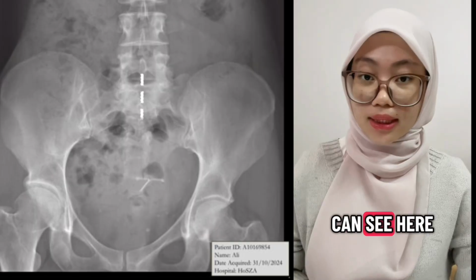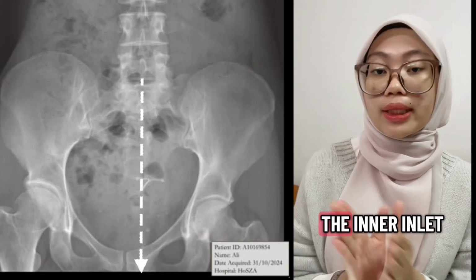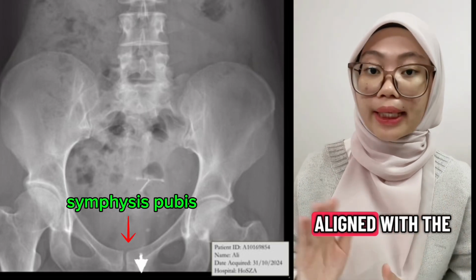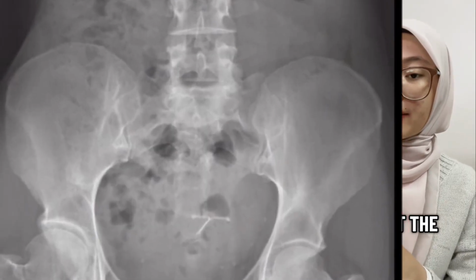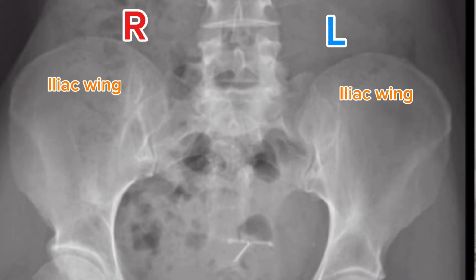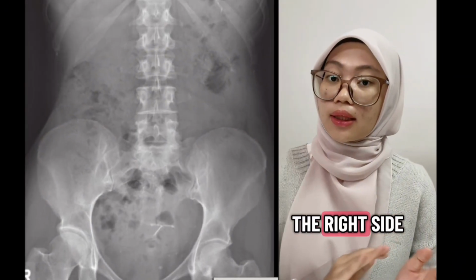But if you can see here, the sacrum is not aligned or centered with the inlet of the pelvis and not aligned with the symphysis pubis, because we can see that the width of the iliac wing is larger on the right side. So it concludes that the patient is rotated to the right side.